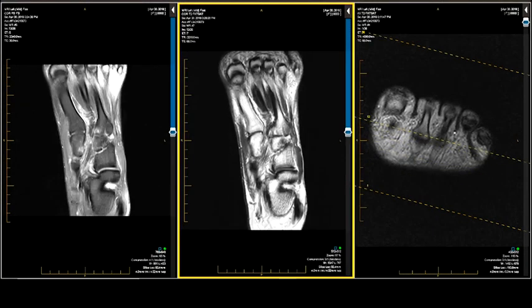What's the second main ligament you're going to check? I don't care about the other ligaments for now. Ask yourself, what is the second main ligament you're going to check? The Lisfranc ligament. Every single time. Does the Lisfranc ligament retract? It does not retract because it's in this tiny, teeny little space. So when it tears, it might do this. Better check it. That may not be the diagnosis, but then again, it may be. Going to have to decide.